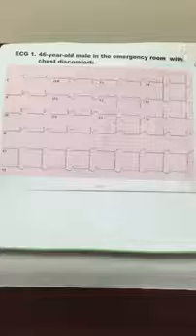So once we've done that, we can now look more in depth at the QRS complexes for what we call Q waves. And basically Q waves are going to be the first wave in the QRS complex. So if you see here, we have the P wave, which we've been discussing. Then the first dip will be your Q, then R, S, and then we'll get into this later, the T and the U wave. But we're focusing on this.